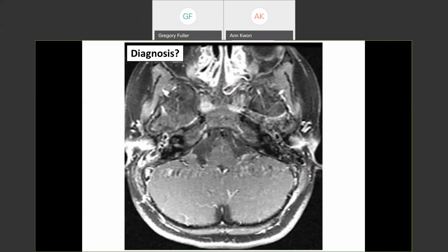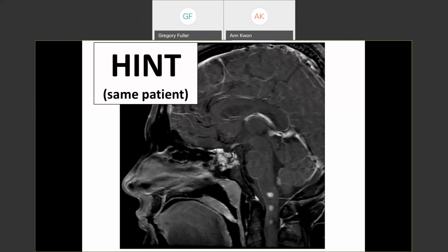Now, how would you get this, how could you even find it? It's a needle in a haystack. Dr. Caillet says schwannoma, Dr. Cathcart says optic pathway glioma. I would like to call out and compliment Dr. Susanna Caillet, one of our outstanding MD Anderson Cancer Center neuroradiologists.